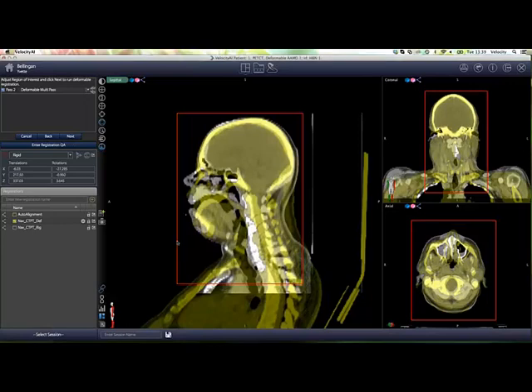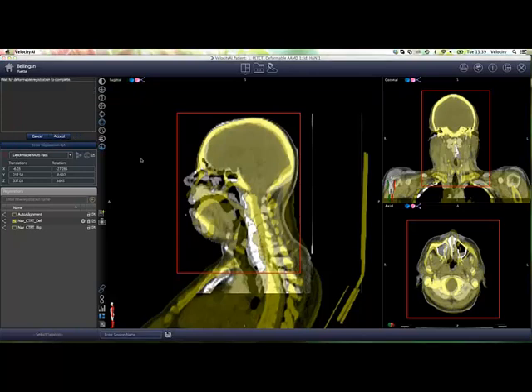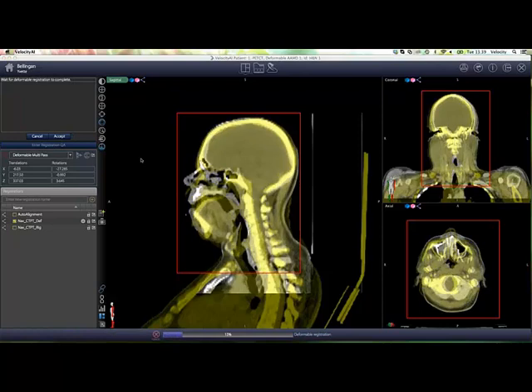All right? I cannot review this because I can't tell you how good the registration is by looking at the PET. So what I need is I need to go back and I need to select my CT part of the PET and then select my registration. All right, now if you look at this, you can see that's the deformable, and once again I'm just going to change the color so that you can see secondary is the yellow and the primary gray. Okay, and if you difference between the rigid registration and the deformable registration, you can see that there's a big difference. So there's 3 ways.